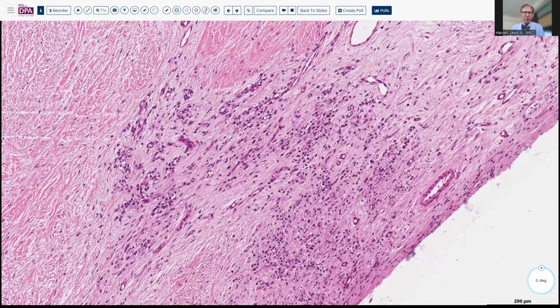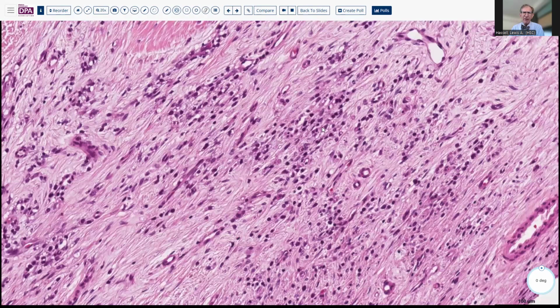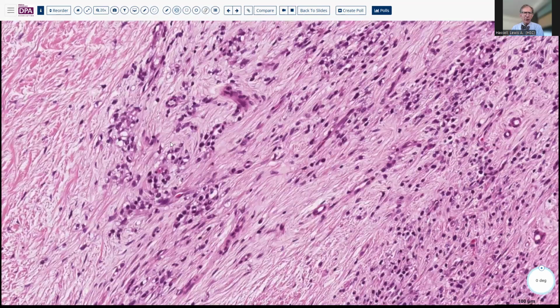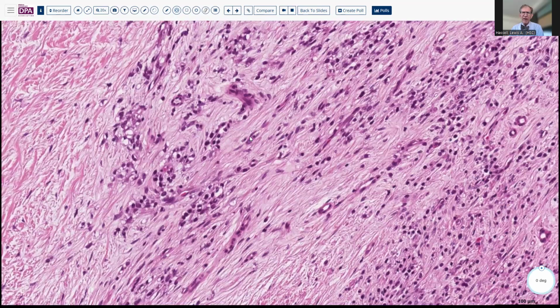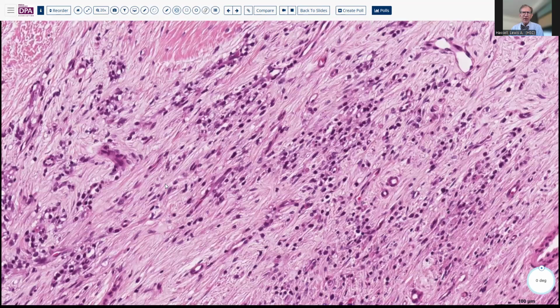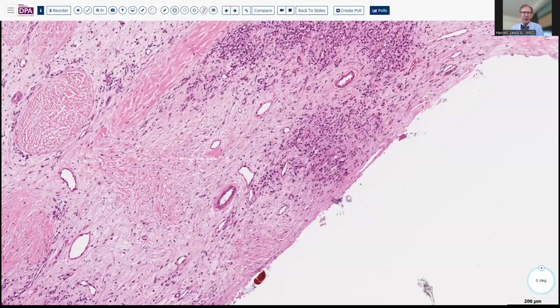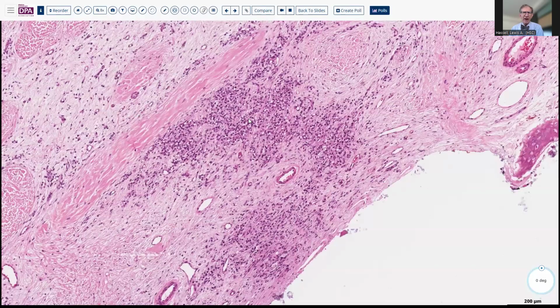Is this neoplasm? Well, you notice here that we do have this nice delicate vacuolization of the cytoplasm of many of these cells. So they don't look quite like typical inflammatory cells or histiocytes. They very much look like the neoplastic cells, although they're here scattered and somewhat diffusely associated with neovascularization.